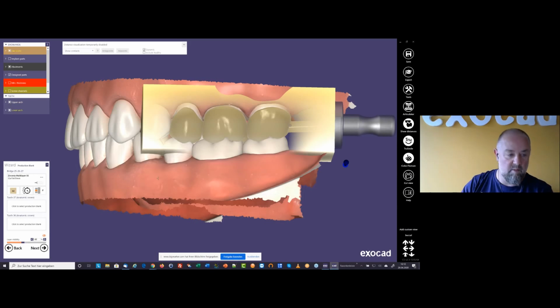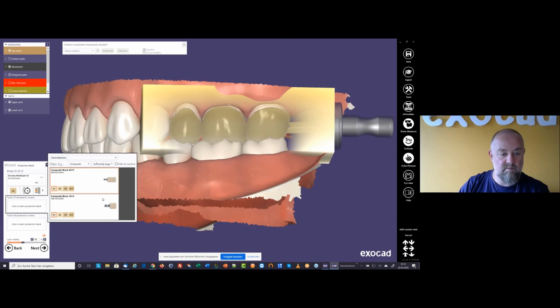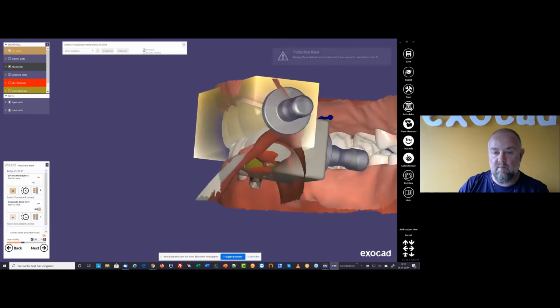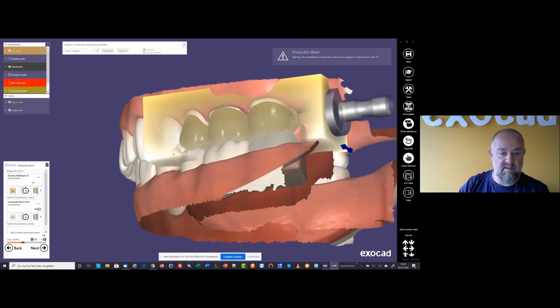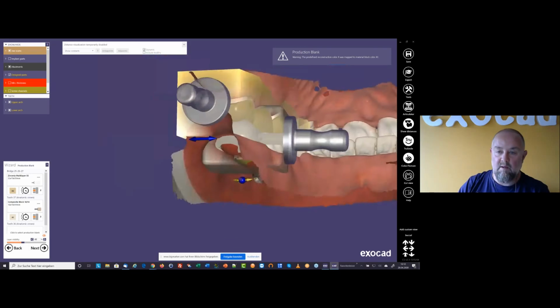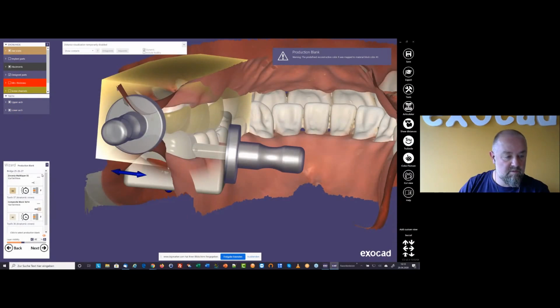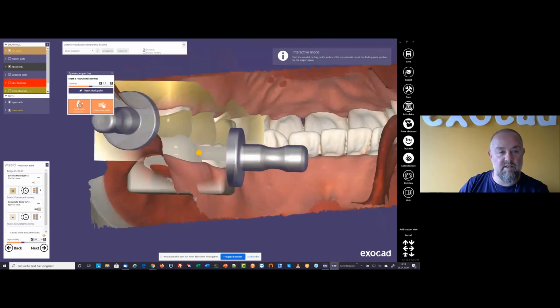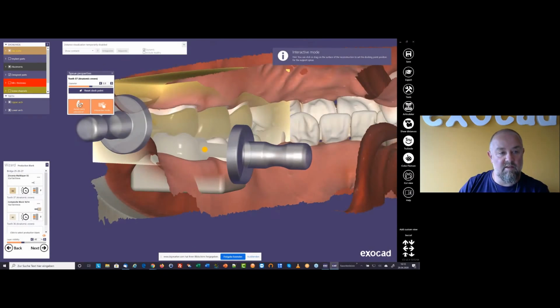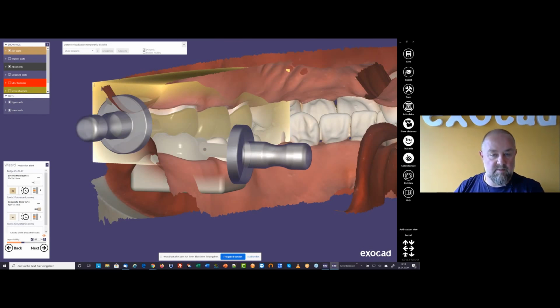and here the holder of your blank. Then let's go to the other blanks for the two crowns. Let's take a smaller one, and you see, by default they are normally already set correctly by the software. What I forgot is that you can also change the position of the sprue. To do that, you click here on edit sprue, and then you can change that position. By default, the sprue avoids a placement on the cavity. This can also be deactivated if you want.